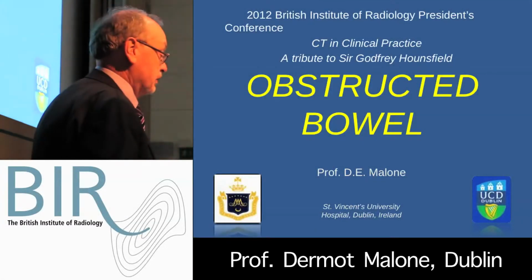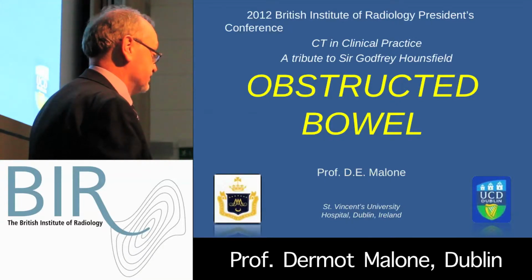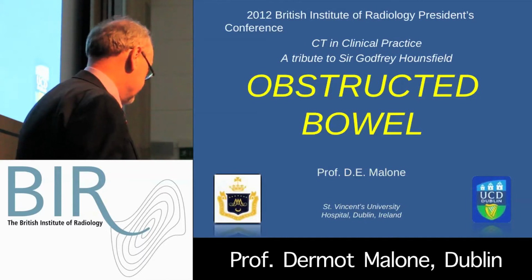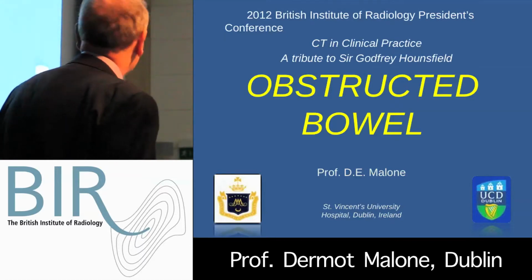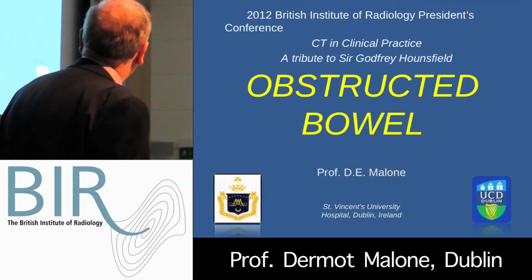I've decided to show a lot of images of bowel obstruction on the basis that this is predominantly a postgraduate course for practicing radiologists. So I'll be asking you to zone in fairly quickly on the abnormalities as we go, and make it pretty heavily image-linked.